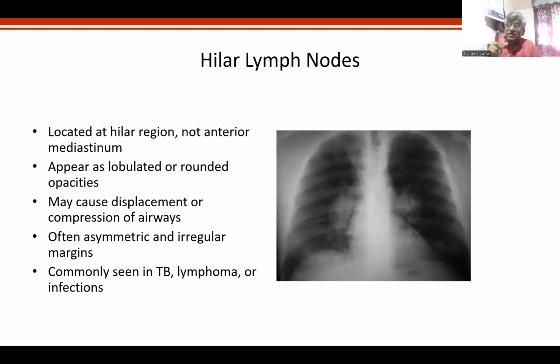You should understand this concept over a period of time. Therefore, only in TB we look for lymph nodes. I would say, don't say TB. Any chronic pneumonia can be associated with lymphadenopathy. Acute and hyperacute pneumonias don't cause lymphadenopathy, or they cause lymphadenopathy, but you will not pick them up. There is a small reactive lymphadenitis, but that reactive lymphadenitis is not reflected radiologically large enough.